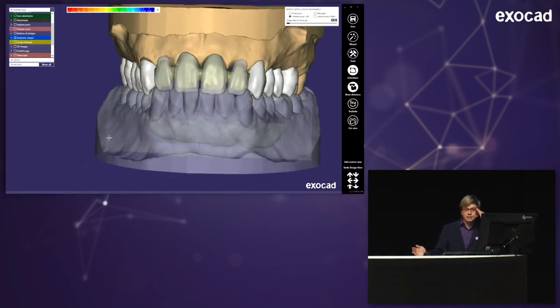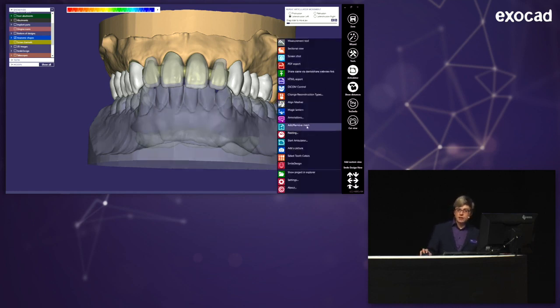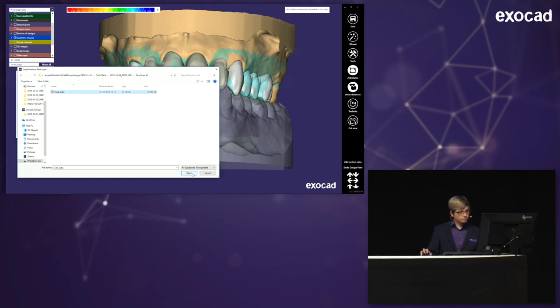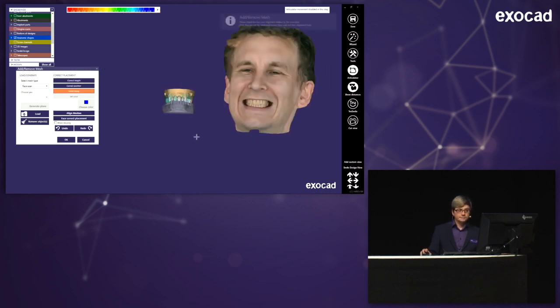What we also can do, what we actually were able to do for a long time now, but we're still improving this with every iteration of the software, is use 3D scan files of your face. Whole face scans, because they're getting a bit more popular now. And for this, you just add a mesh like you would a pre-op model or anything else. And we obviously prepared a 3D face scan for that. And here's the option to take a face scan, load it, so, and here it is.